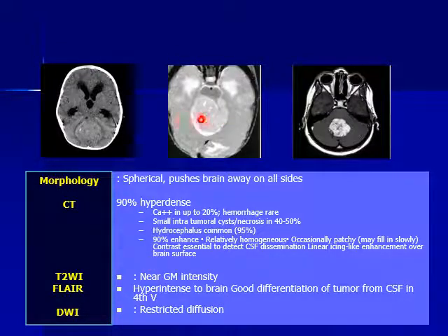The tumor is in the fourth ventricle, so the tumor cells are shed into the CSF and can spread along the CSF to anywhere on the brain surface or along the cervical, dorsal, and lumbar region into the thecal sac, and we will see examples to explain this phenomenon.